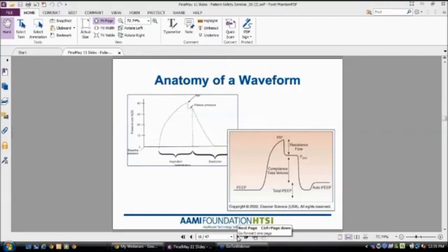In these graphics, we're looking at a volume-oriented mode. Note that in the pink picture on the right, on the left side of the picture where you've got the word PEEP, notice that it's at a certain level. If you followed that along, you can see that as the breath returned to baseline, it did kind of return to that PEEP level. But then you can also see a little rise there as the scalar tends to go off the screen, where it's trapping a little bit of gas and creating some auto PEEP.